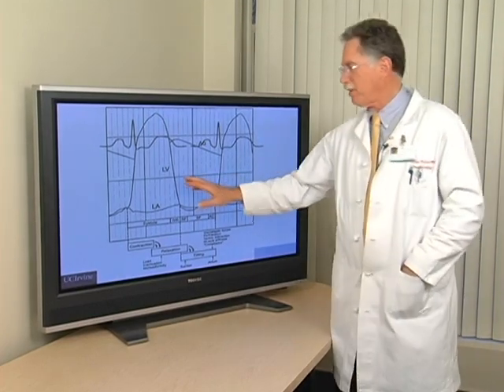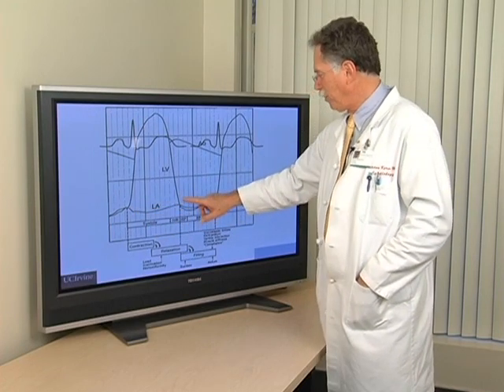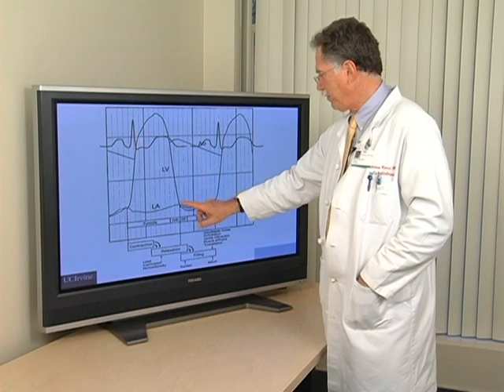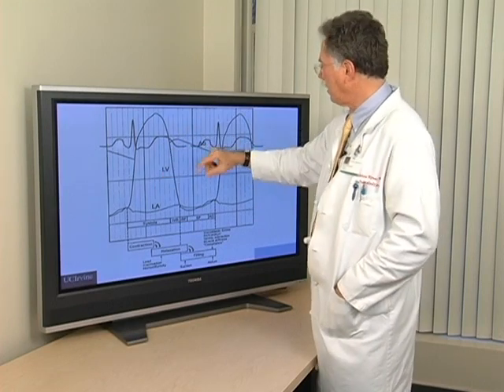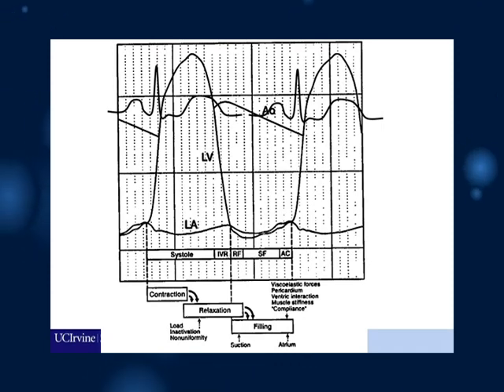Here's another example of those findings. Atrium with an A wave and a V wave. There's an X descent, a C notch, a V wave, and a Y descent. Your arterial pressure is shown here, I think, superimposed on the left ventricular pressure. Different portions of the cardiac cycle have been studied, and we use special techniques to describe these various changes.